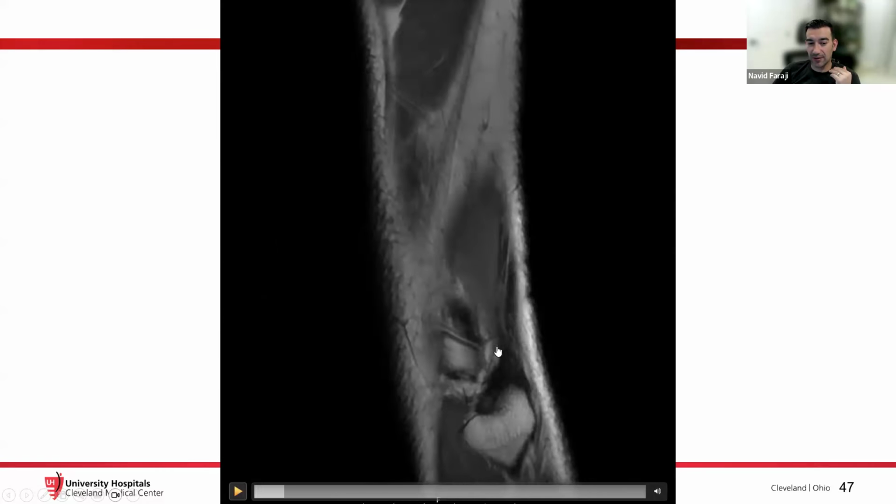And again, dark things are tendons or ligaments usually. We can see the hypointense tendon first thing inserting onto the fibular head, okay? You see these strands, these striations, these are superficial to the fibular head, and that's the peroneal nerve coursing superficial.